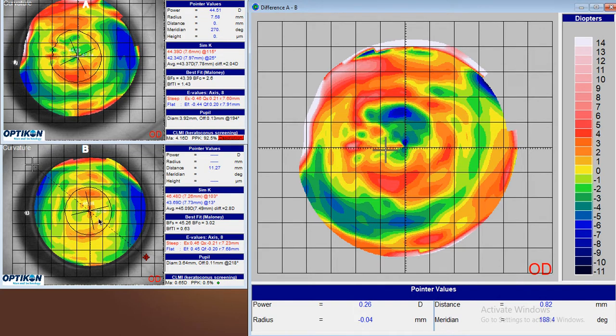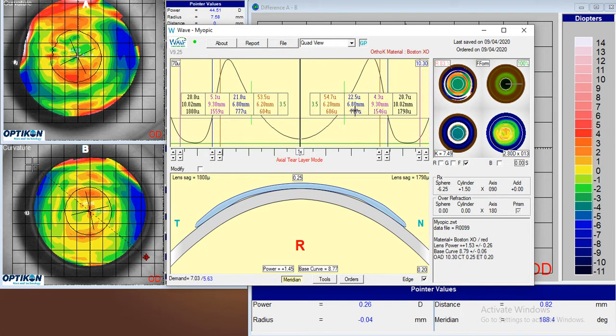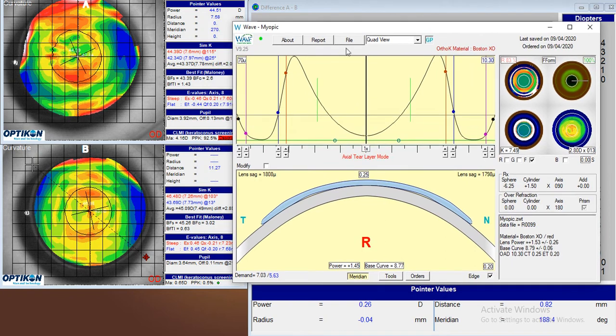So aside from the ocular surface issues, one thing I would do is increase the size of the lens. And let me bring the lens up. So here's the patient's lens. It's a freeform lens, 10.3 overall diameter, 6.2, 6.8 OZ and IC positions. On an 11.2-ish or 11.3-ish cornea, I think we can pretty safely go up to at least a 10.9. Sometimes I'll even go 11.0 on a cornea of this size.